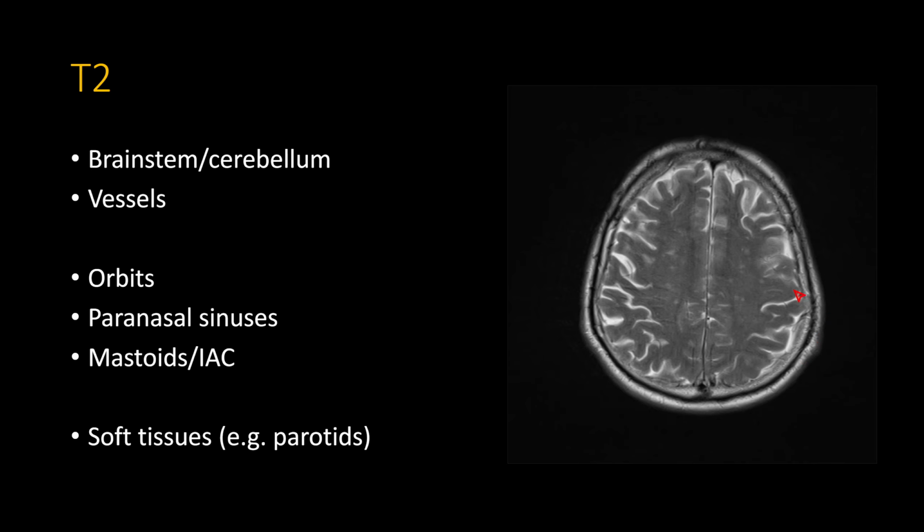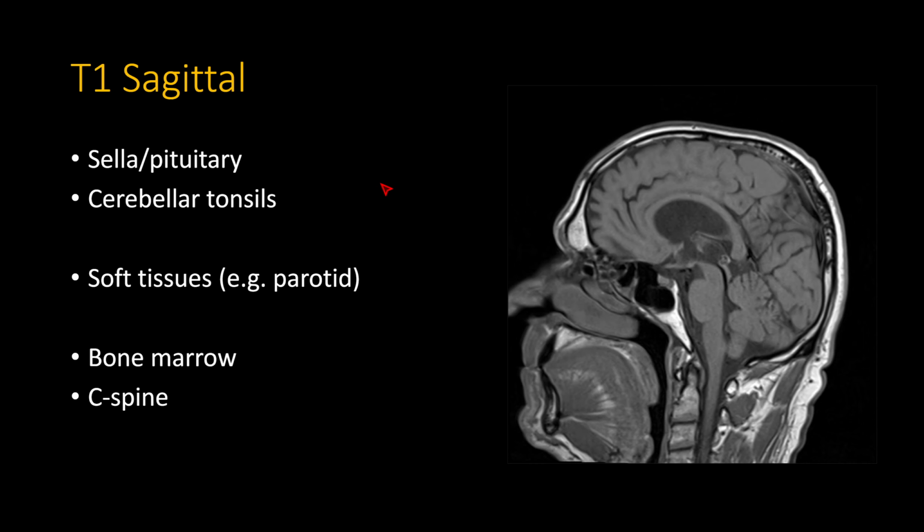So finally, as part of a routine brain MRI, which is done without contrast, I go and look at the T1 pre-contrast images, which are typically obtained in the sagittal plane. Now, the sagittal plane is very good for looking at gross anatomy, particularly anatomy of midline structures, and some of the midline structures that I think are best seen on sagittal and not necessarily on the other sequences you've already looked at would be things like your sella here.